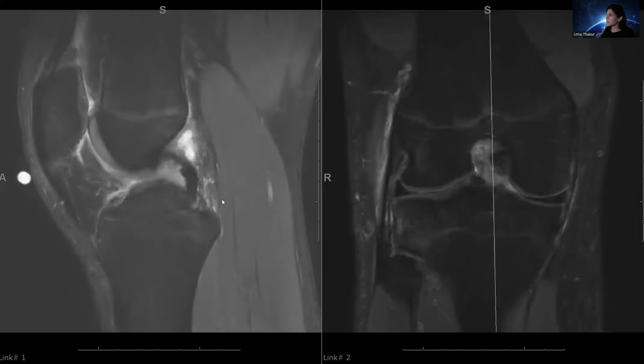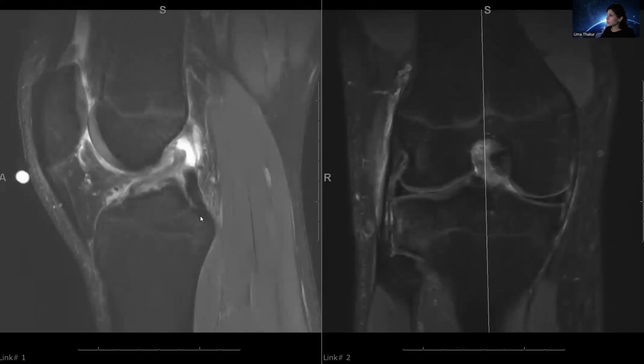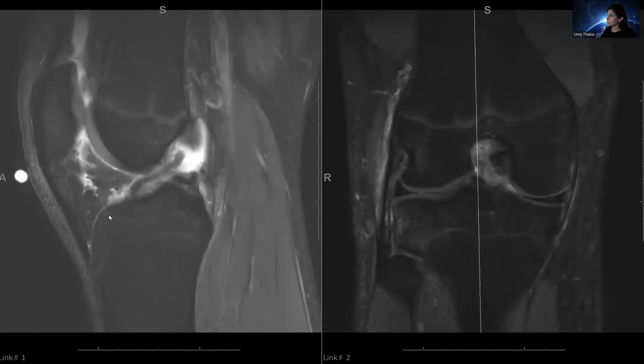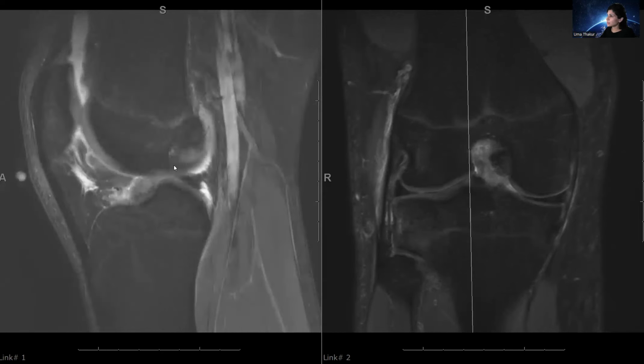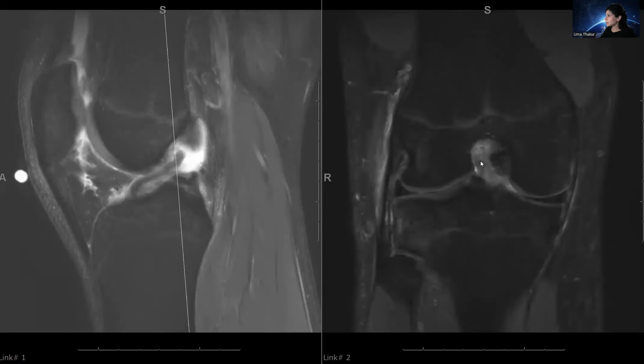Case of a 19-year-old man who had sustained a pivot shift injury, and you can see that this ACL is completely disrupted proximally. It's undulating in contour and edematous. You can also appreciate that very well on the coronal imaging. The stump is right here, the origin is intact, versus just distal to that, it's absent.